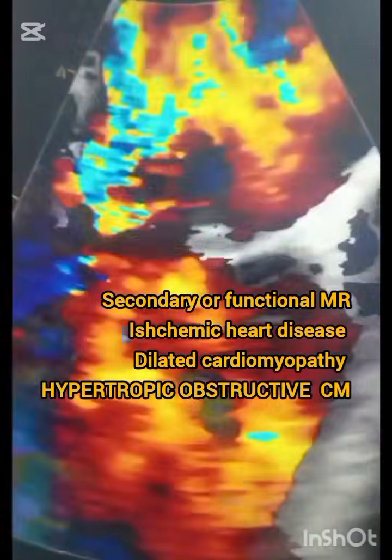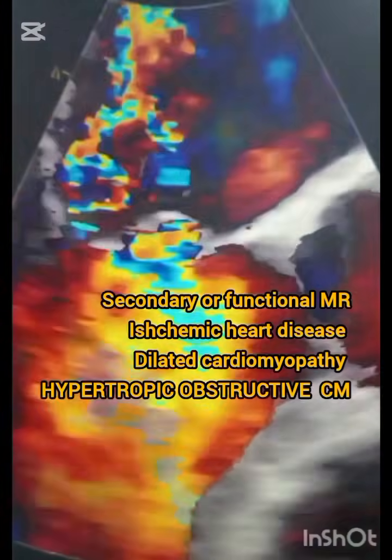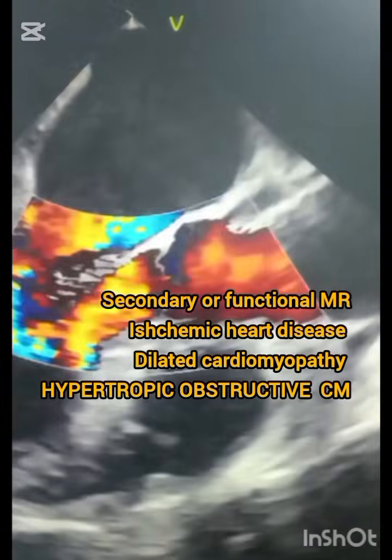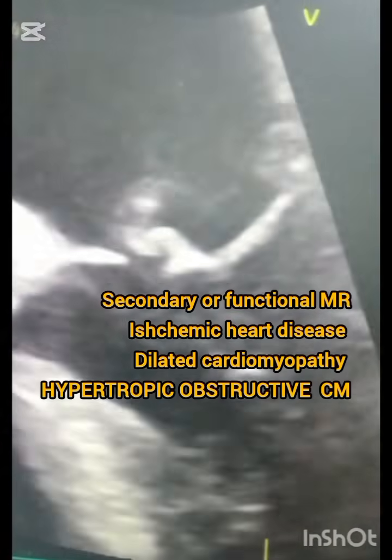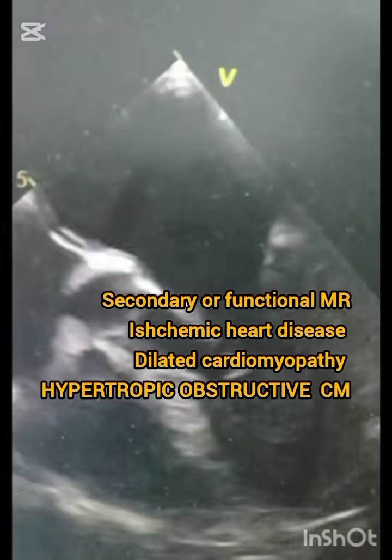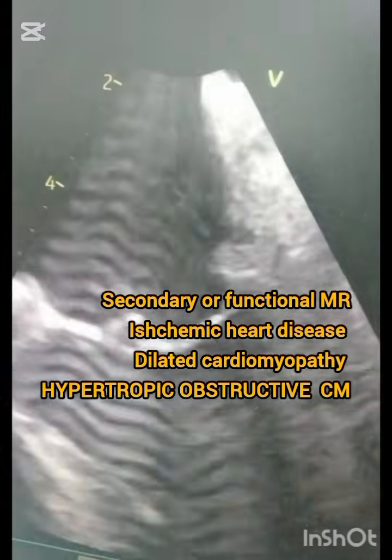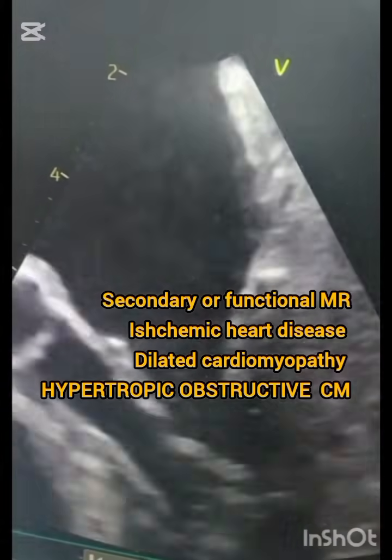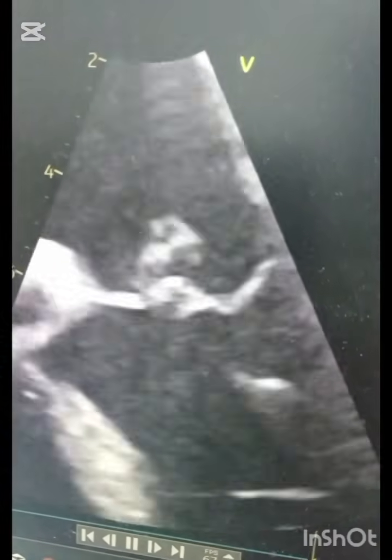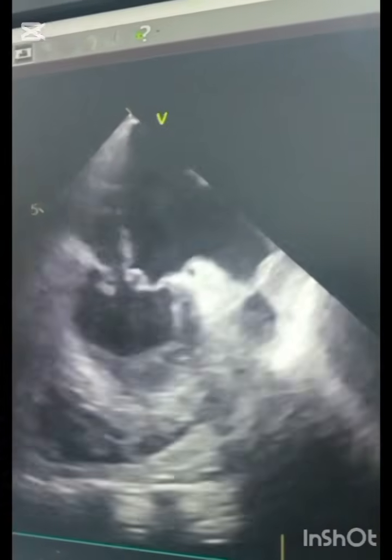In secondary or functional MR, the primary abnormality is not the mitral valve apparatus but the surrounding structures, and the MR develops as a secondary problem, like ischemic heart disease, dilated cardiomyopathy, hypertrophic obstructive cardiomyopathy. These are the two major categories of mitral regurgitation: primary MR and secondary or functional MR.